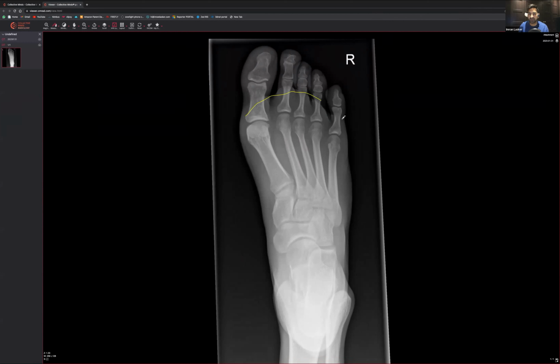So you're looking at the soft tissue around here. Unless it's been very, very acute and very, very significant, you may not see very much in the way of soft tissue swelling. You'd be looking for something quite extensive. When it comes to the actual toes, it can be a little bit more obvious because you may have a really normal side and then it becomes really, really bulbous. I know that's quite an exaggeration, but it can happen.